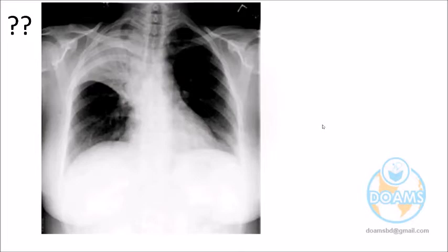What about the trachea, Dr. Hind? Who will be silent actually will learn very less, no doubt. So try to talk if possible. Where is the trachea position? Deviated right side. Where right side? Dr. Abdullah, do you agree that trachea is position right side or shifted? Dr. Rashid as well, please.